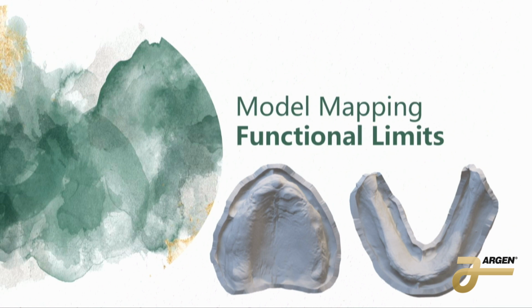That is okay. I think you should still carve it in the model at the beginning of your model trimming. And then when you get to the virtual wax up, you can turn it upside down and you can clean it up and smooth it. You can do a 2D cross section, which I'll show you. You can check the depth from there.